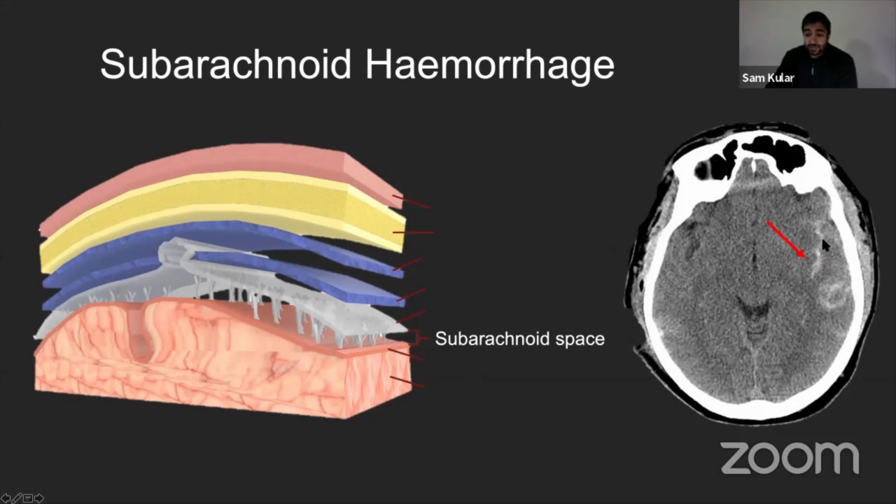So we tend to get a more sulcal pattern of bleeding, dispersed throughout the brain invaginations in a sulcal and gyral pattern, rather than in a subdural or extradural bleed, which tends to stay on the outside. These can go into our small fissures within the brain a lot easier.